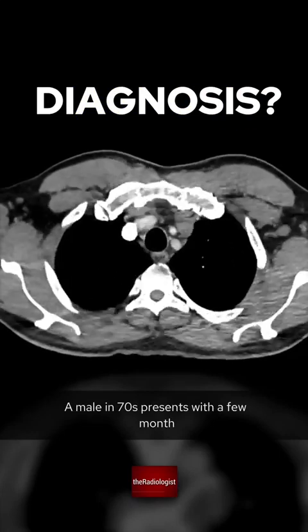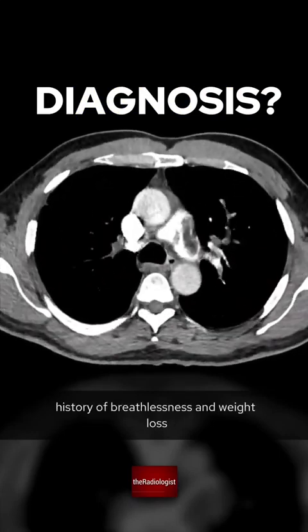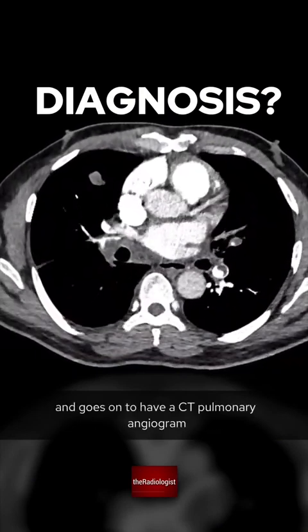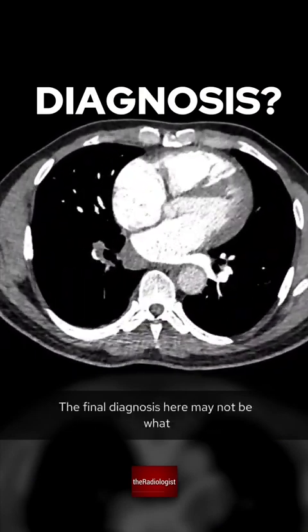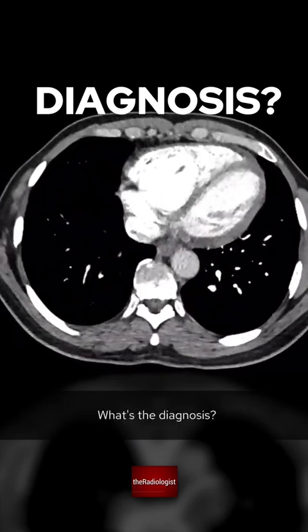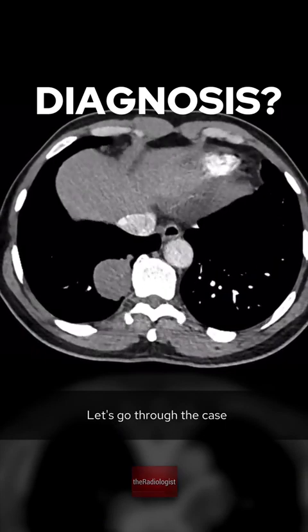A male in his 70s presents with a few-month history of breathlessness and weight loss. He eventually presents to the emergency department and goes on to have a CT pulmonary angiogram. The final diagnosis here may not be what you initially suspect. What's the diagnosis? Let's go through the case.